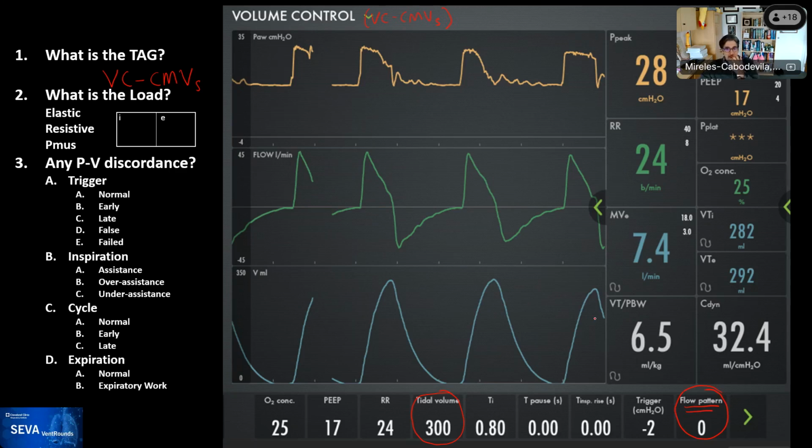Yeah, thank you, Simran. I'm going to put a little asterisk down here for Simran. Simran has just pointed out why the fourth breath, which actually I'm going to call the third breath, Simran, why is the third breath volume lower? So we're going to get there.